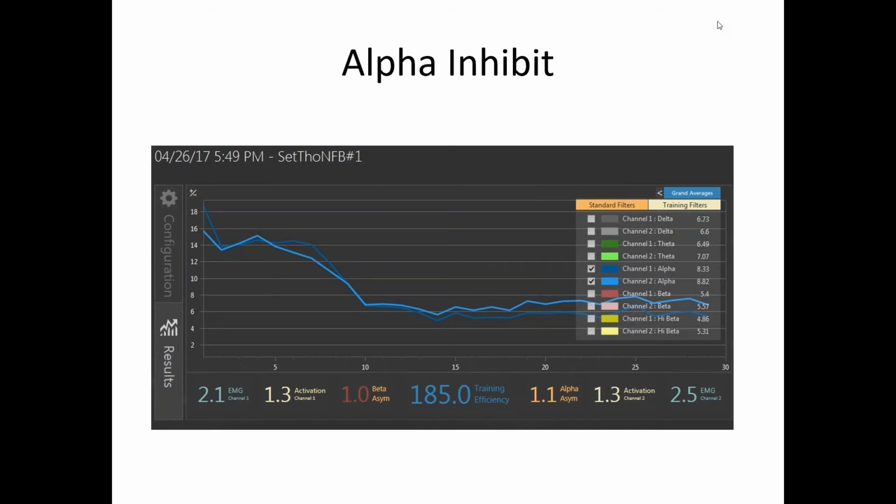Exactly. And that's where we're saying just a small change in a key area could make the change we're looking for. So that's why we recommend that you watch all the frequencies, delta, theta, alpha, and beta, and that you look at the movement of those frequencies as a whole, which we do.